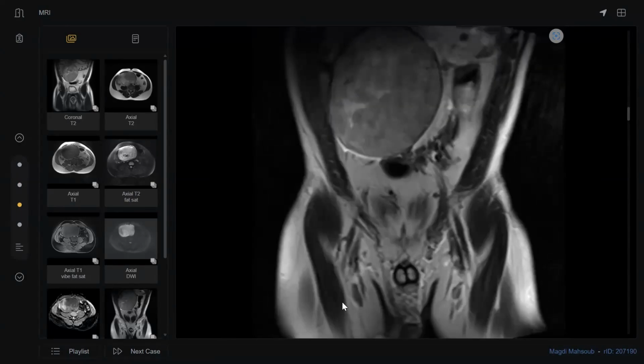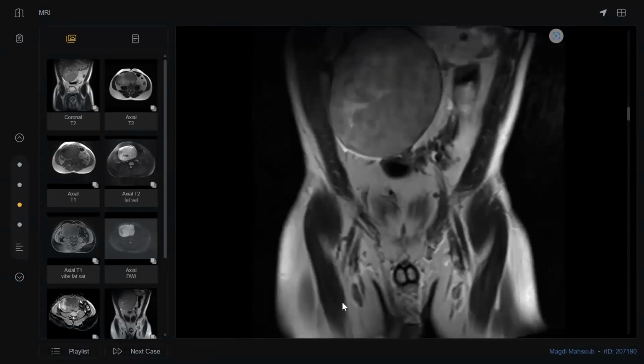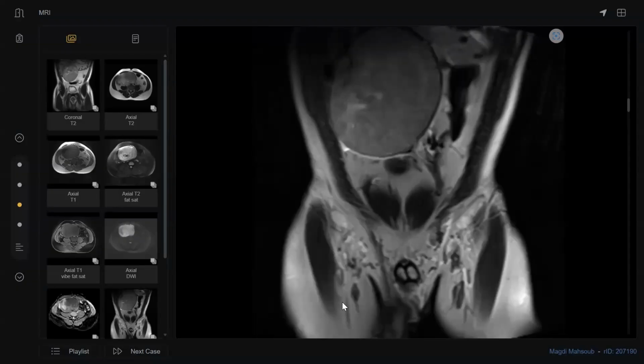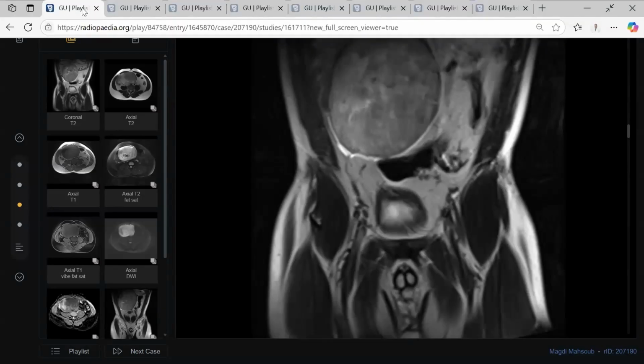Anyway, if you tell the examiner it is a large retroperitoneal mass lesion, maybe a malignancy of undescended testis, he will be happy. Especially if you detect the site, it is a left side, not a right side, because this is the testis of the right side. Thank you, doctor, so much. You did very, very well.